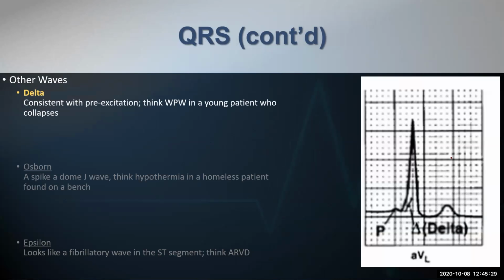So this section is just a hodgepodge, which is another SAT vocab word for you, Neil, of other things that you can see on top of the fragmented QRS, as well as the bundle branches that can cause abnormal appearances to the QRS complex.